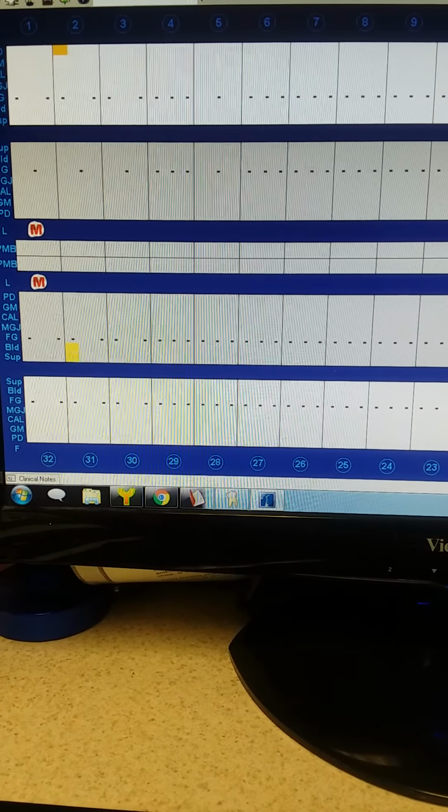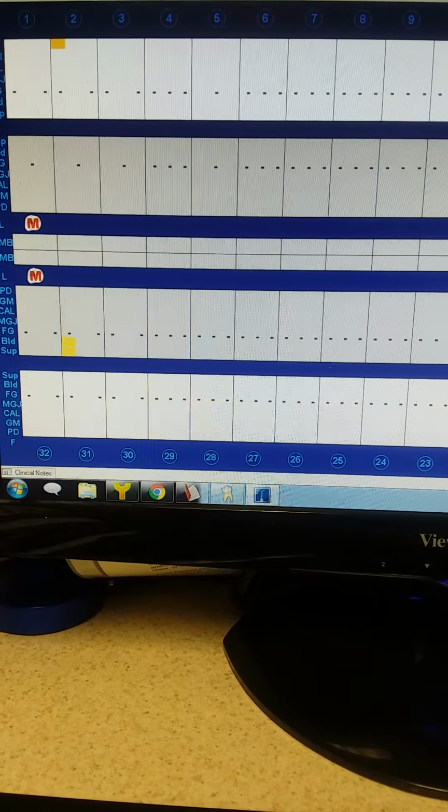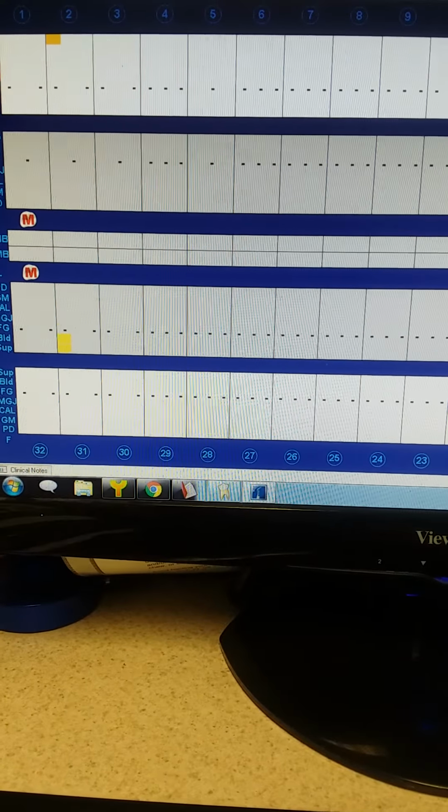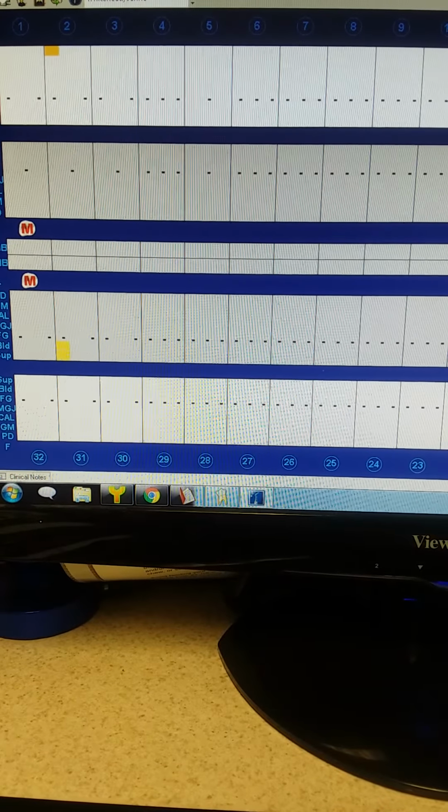This video is over periodontal charting with the hygienist. I pulled up my own chart here. This is to let any assistants who are charting with the hygienist know how to enter in the perio chart.